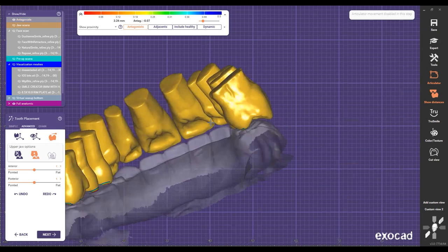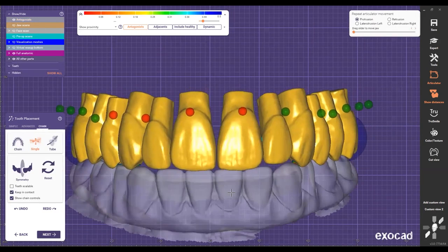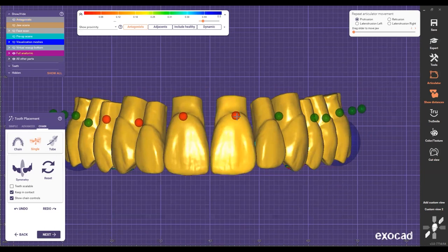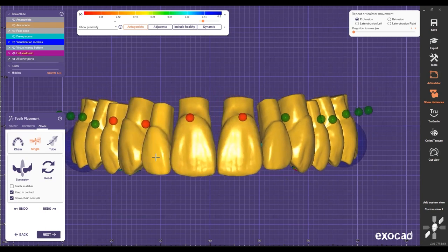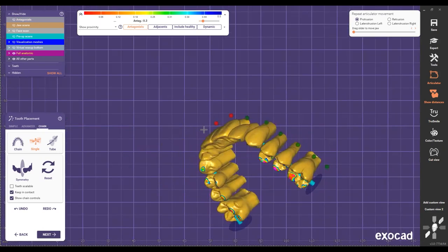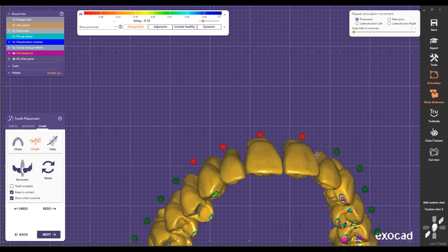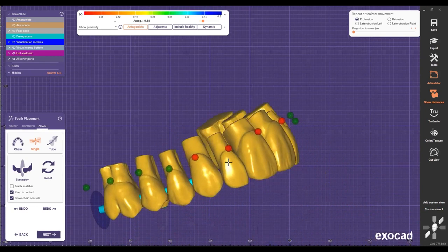So now here, I just go to this one. Now, since I have this already fixed, I'm just gonna try to change the angulation of this tooth here so everything follows in a nice curvature. Everything looks good there. Now I'm gonna go and bring this lateral down right there, and follow a nice inclination of this lateral. So I'm gonna just bring it out more, and I just start checking different views to make sure it looks good here.